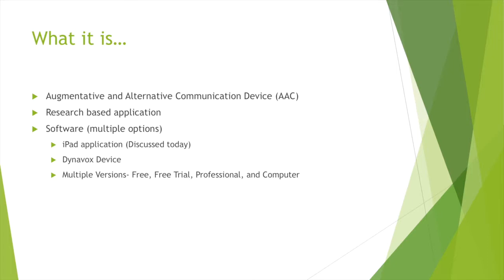It's the entire application. You can make edits, you can change pages, you can add pictures, topics, and so on. I'll show you more about what the application can do later in the presentation. It also offers a professional application and an application that can be installed on your computer.